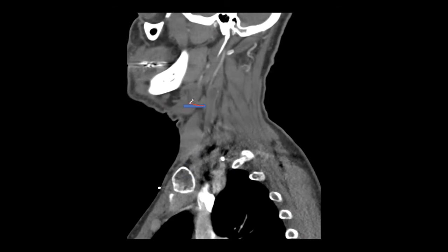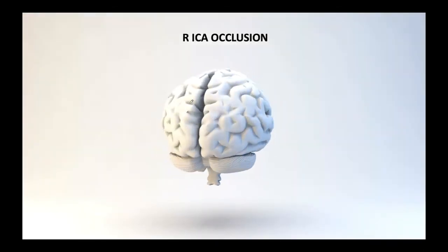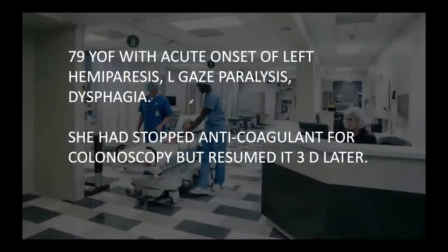So you can see a tubular structure, which this time is completely occluded. And it has a thrombus within it, complete occlusion of the right ICA. And on the other side, you can either be CCA or it can be ICA. The reason is you can have a high or a lower split of the bifurcation.